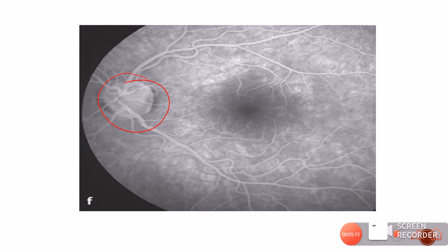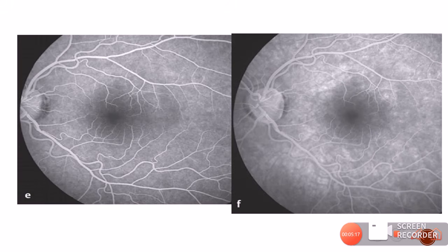Now this might not be so evident, however, if you compare this image with this one. So this is the venous phase or the late AV phase, and this is actually the recirculation phase. So just have a look at the recirculation phase and the venous phase. Just compare the vessels. How bright are the veins looking over here and how dull do they look over here? And look at the choroidal fluorescence also, how it has become more patchy in the second image. That means the dye is now actually disappearing from the retinal and the choroidal circulation, and the disc has actually started getting stained.